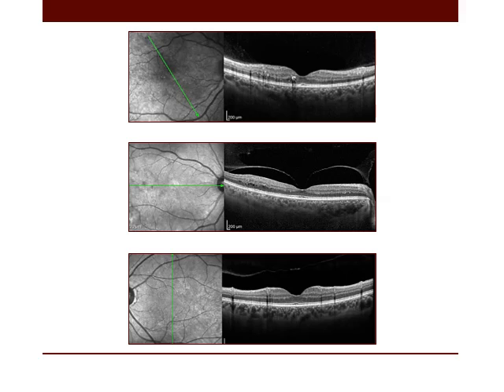Another patient with partial PVD, residual adhesion centrally. Hopefully, it will return into complete PVD soon. Another patient, a lucky one, with complete PVD. However, as PVD occurs, don't give 100% assurance to the patient that there are no vitreomacular interface abnormalities going to occur. Sometimes after PVD, even a residual layer from the cortical vitreous remains on the retinal surface and proliferates to form a membrane.